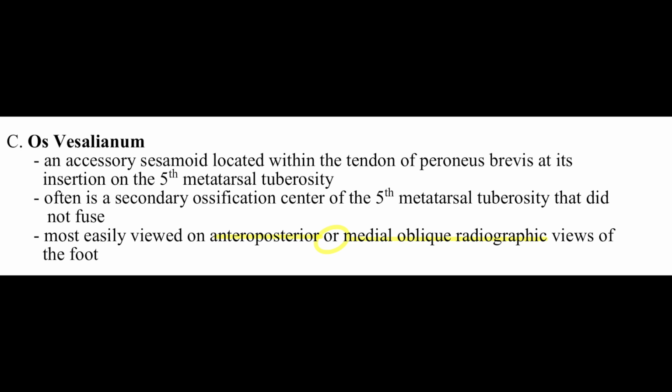So let's do a quick crash course of some basics in radiographic imaging while adding to what you already know from anatomy. And just to make things even better, I got some help from a friend of mine. In this section, we are going to cover 4 different radiographic views and go over the accessory ossicles discussed in anatomy. This may seem daunting at first, but we'll go step by step.